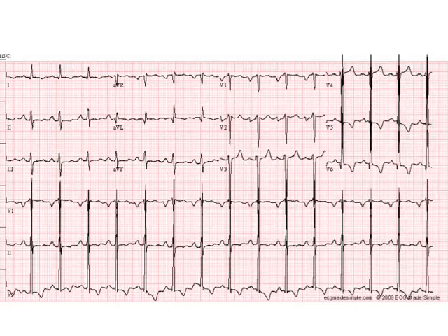This is an ECG of a 68-year-old man with a documented history of an idiopathic cardiomyopathy and normal coronary arteries. Let's look at his ECG. We can start by examining the long rhythm strips that are at the bottom of the tracing.